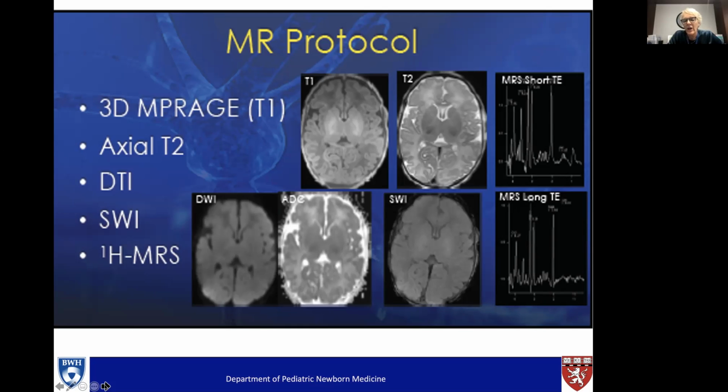You can see on the lower panel, there's a degree of blurry images, so-called DWI and ADC. This is diffusion weighted imaging, and it's a map that comes from the diffusion called the apparent diffusion coefficient. Now, why do they look so blurry? Well, in traditional MRIs like T1 and T2, we are vibrating a proton and we're looking for the resonance back from that proton.